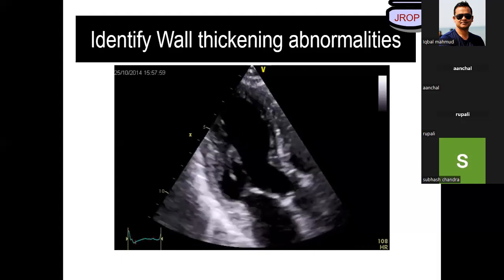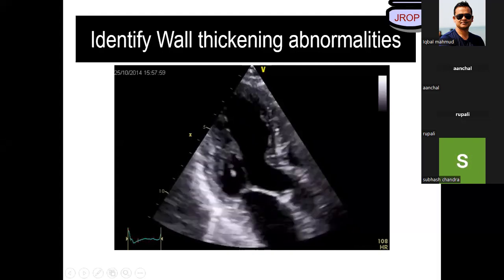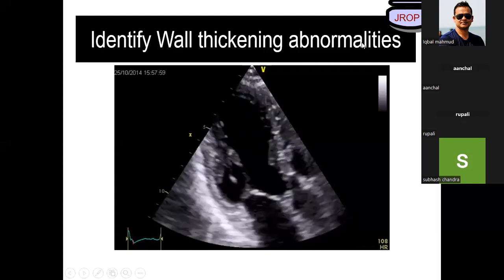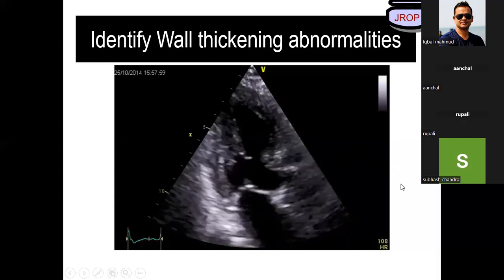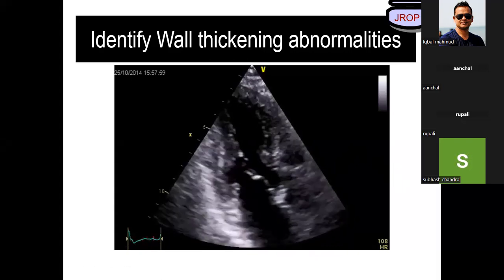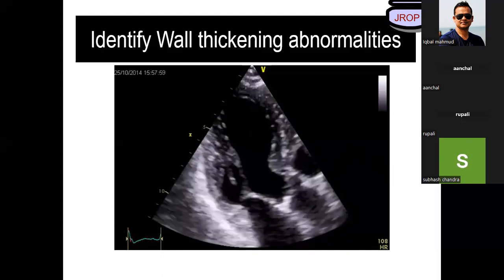All right. So the patient is in atrial fibrillation, just a minute. Anchal, may I say something, sir? Identify yourself. Dr. Ojha, sir. Yeah, go ahead. Hyperkinetic it appears. Sir, I would like to answer, please. Dr. Prasenjit, sir. Prasenjit, go ahead. The tachycardia, mostly AF, sir.